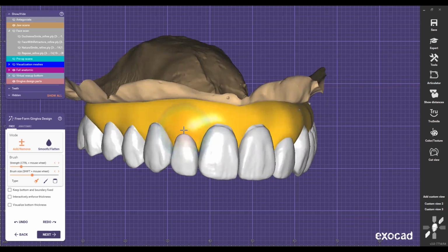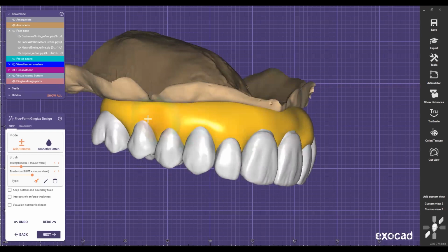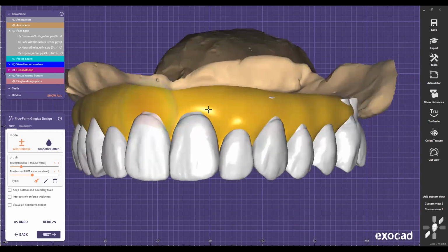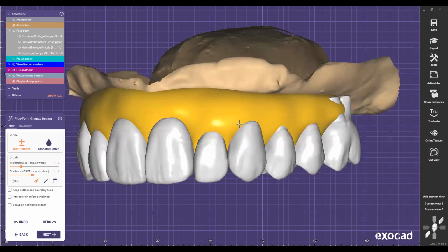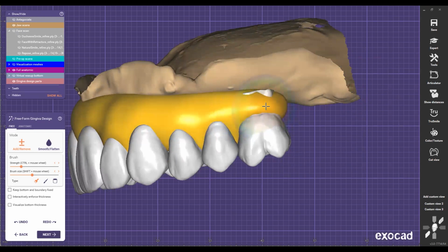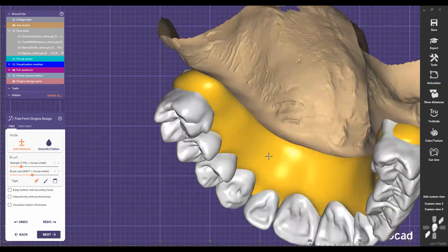If I'm gonna try to keep it there, and then later once it's merged, I'm gonna try to just pull it so I don't show this junction of the teeth here, right? If the neck of the tooth, the CJ, is there, so I don't change it. So I don't compromise that. So I'm gonna go ahead and start adding material.